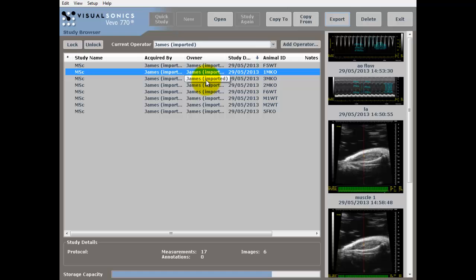So that's a brief summary, a whistle-stop tour, as it were, of the one-dimensional cardiographic analysis using the VisualSonics Vevo 770.